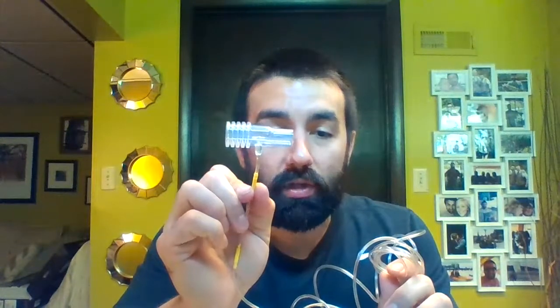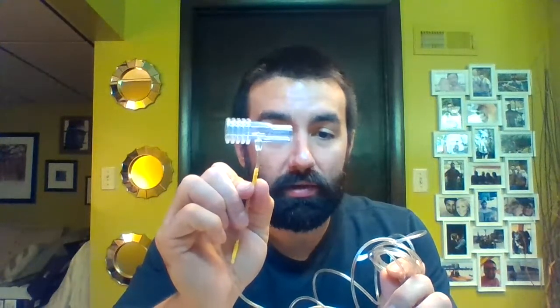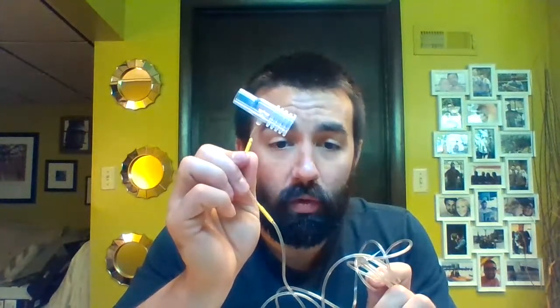The other thing we have, and this is the side stream, so there's mainstream too, is a continuous waveform capnography. So it's tidal CO2 monitoring, but it gives us a value and it gives us a waveform. This can also be used for confirming airway placement, and it's actually better than the colorimetric because it gives us a value. And a picture is worth 1,000 words. We can tell a whole lot about what's going on with that patient.